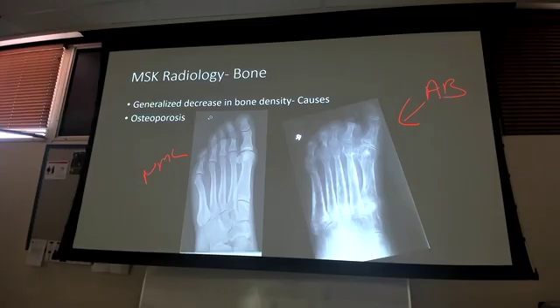So what do I see here? The biggest thing I see is I am going to be comparing my medullary trabecular pattern, comparing those two. Look at the difference in density. Look at how much more radiolucent the abnormal, the osteoporotic patient is, okay? I can make out a decent amount of density sitting in there from looking at the normal, and then when I go to my osteoporotic one, it almost looks like a darker kind of black, almost like it's air going through there.